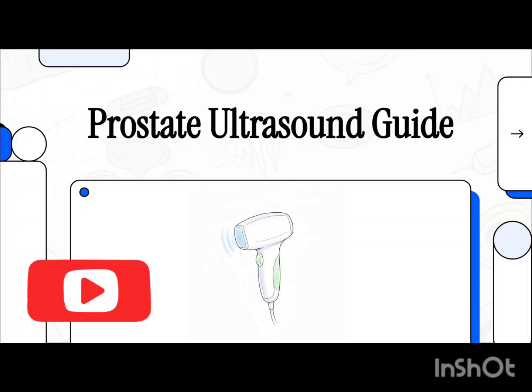Welcome to The Explainer. Today we're stepping right into the high-tech diagnostic world of medical imaging to decode the prostate ultrasound. You know, when a doctor is staring intently at those stark, black and white sonographic images on a dark monitor, it can honestly look a bit like abstract art to the rest of us. But today we're going to break down exactly what they're looking for. Because, as it turns out, these visual echoes, these shadows and highlights, reveal some absolutely incredible, hidden realities of male health. Let's get into it.